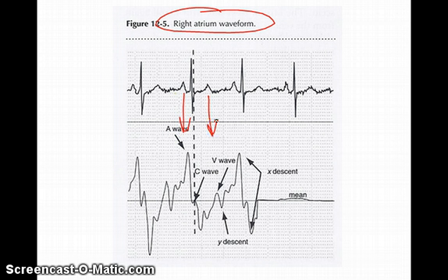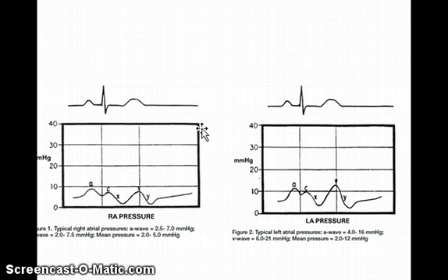This isn't a really good example, I don't think, but it's showing you that the pressure does increase during the P wave, during atrial contraction, and then the pressure does increase here on the T wave, which is the heart at rest, the heart at diastole. So if you were to follow this, P wave, T wave, it's showing you where the atrium pressure increases.